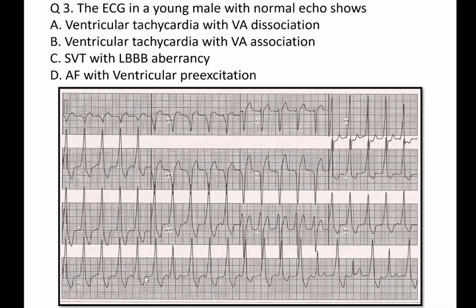So you find that the PP interval is also regular and the number of P waves is much lesser than the number of QRS complexes, and the P waves are upright in leads 2, 3 and aVF, indicating that the atrial activation is occurring from the sinus node, while the ventricular activation is occurring from the VT focus, and at times the atrial activation is able to capture the ventricular activation either completely, resulting in a narrow QRS, or incompletely, which results in fusion beats like these beats which are intermediate in morphology between the wide QRS VT beats and the normal narrow QRS beats.